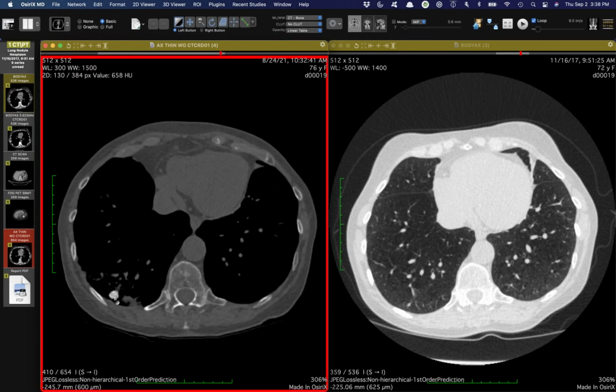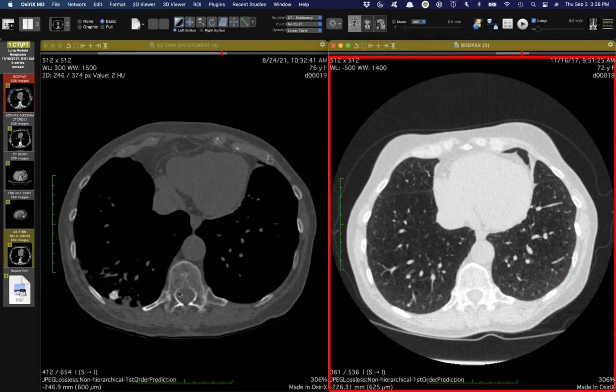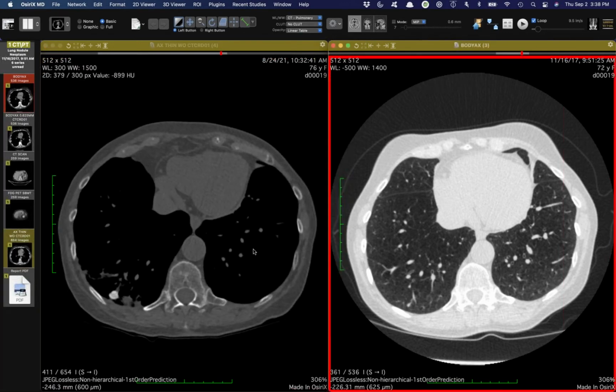But yeah, Jeff, your comment on popcorn calcification, we've all seen lots of cases of metastases from chondrosarcomas or whatever. I never count popcorn calcification in the lung as a definitively benign pattern of calcification. But this is just driving home the point that, especially when something's new, and David's point too, the fact that it's lobulated doesn't necessarily equate to it being benign popcorn either, because of the amorphous calcium.